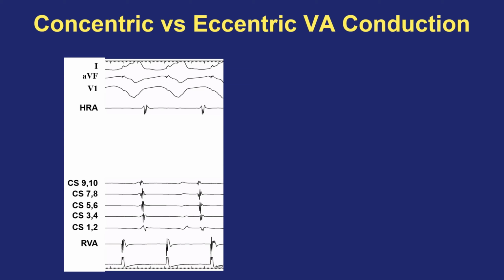If we look at the atrial activation sequence, we can see the very first atrial electrogram that's shown is in CS910, and then the wavefront travels leftward out toward CS12, the lateral left atrium, but also at the same time it travels laterally to the right toward the high right atrial catheter, which is also late.